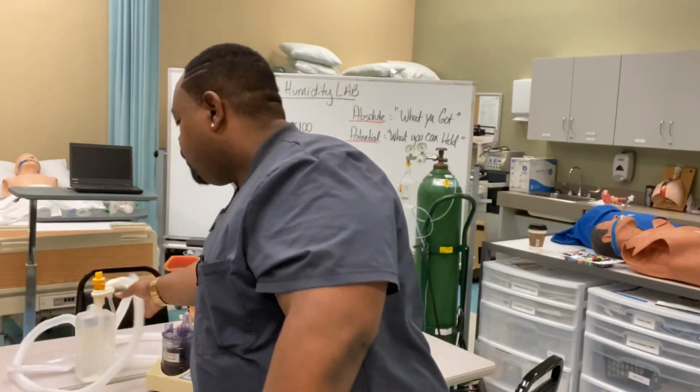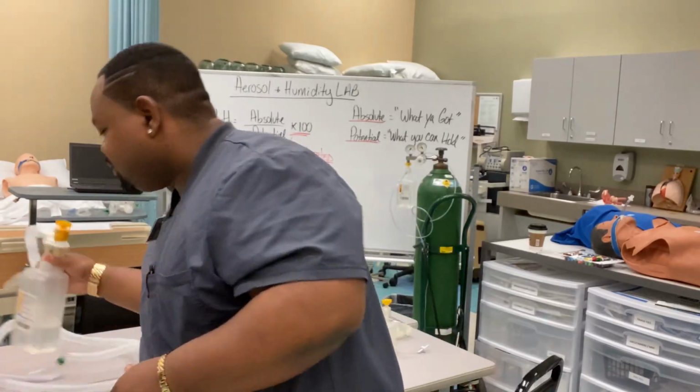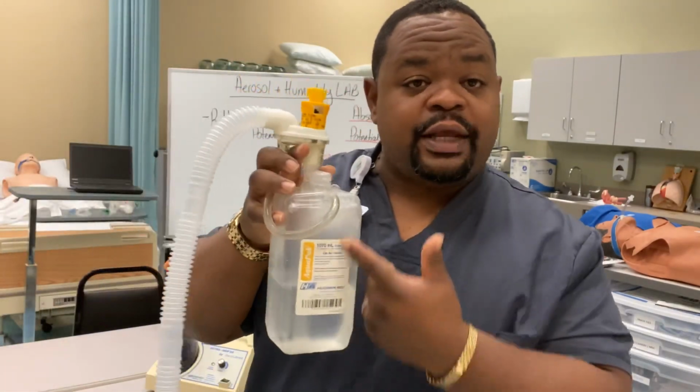As I said before, a lot of times these lessons will run into each other, right? Aerosol humidity runs right into high flow, low flow, okay? It's because it's all one big pot of respiratory. Now, today I'm going to focus on showing you the humidifiers, and then just touch on the aerosol or nebulizers. These high flow devices are an aerosol setup, but it's called a nebulizer, right?